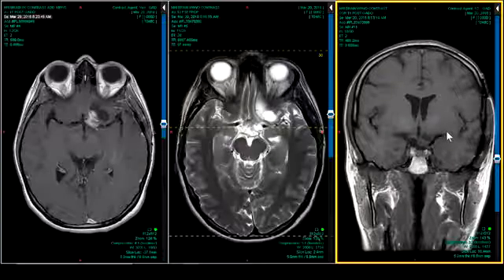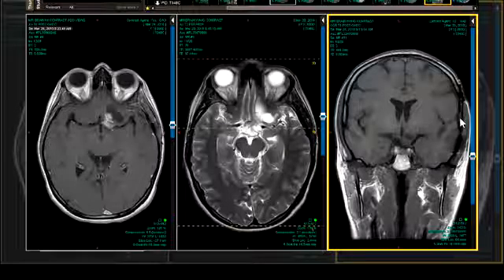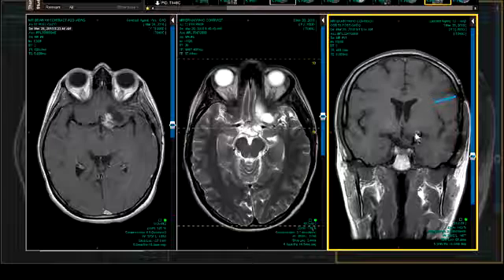So the first thing, when you see a lesion, you say, okay, is this coming out or not? Okay, if you say it's coming out, then you got to start thinking, well, coming out how? For example, in a pituitary, if there's a sellar or suprasellar mass, you should be looking and seeing, is the sphenoid aerated? Because if it's not, they can't use a transsphenoidal approach. Are there kissing carotids? Because that's another contraindication to the transsphenoidal approach. Okay? So you have to start learning these approaches because there's a limited number, because once again, you can't just go through the motor strip or anything.